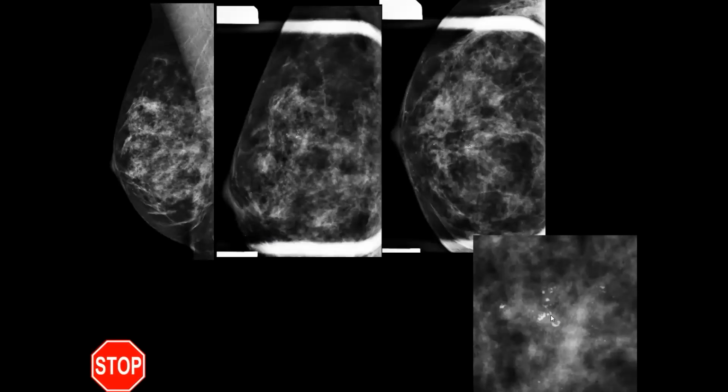This looks like a parenthesis, this looks like a comma, this looks like a period. I think there's another comma here. It looks like a colon. So it looks like someone hit all the punctuation keys on the keyboard. And so that's multiple different shapes. And that's the definition of pleomorphic.